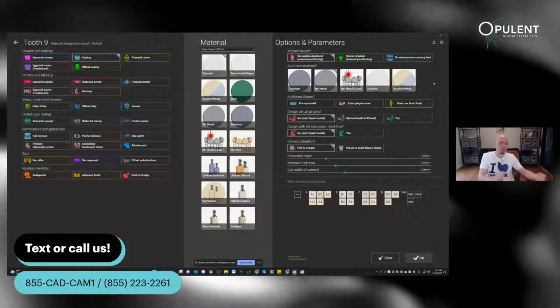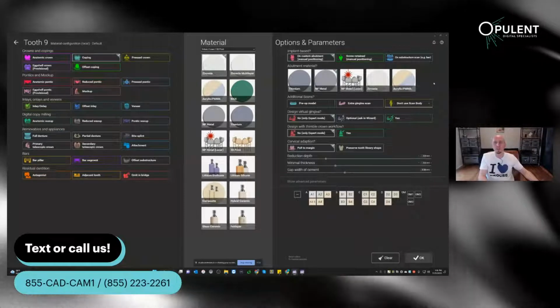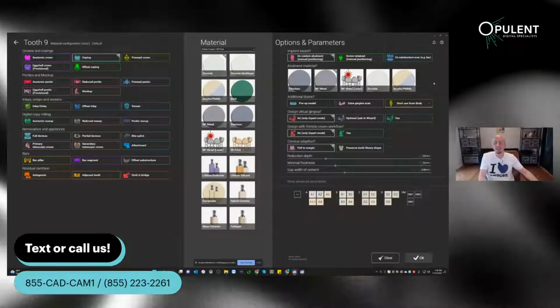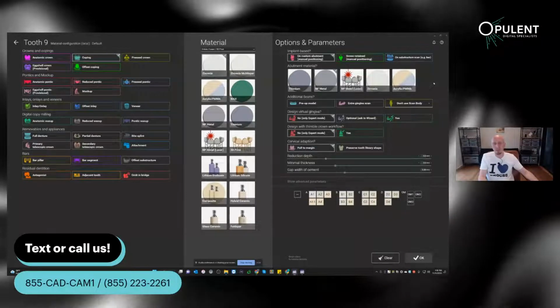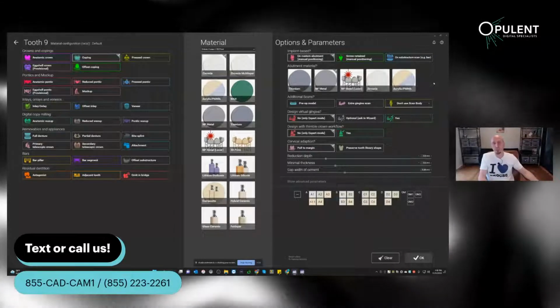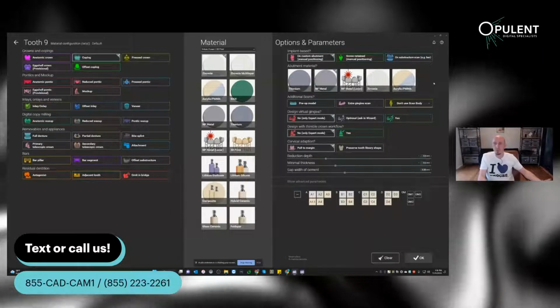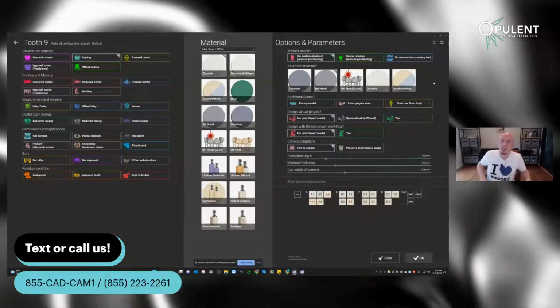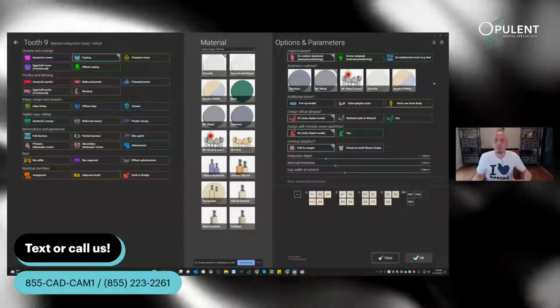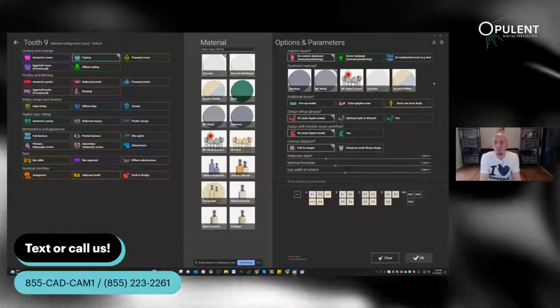And you're looking at things, trying to figure out how did you miss that? Stuff happens like that. Maybe your window is now too short to return the part. You can do that later, but to order another part in and get that all taken care of that way. So your quicker solution is to change your design really quick.